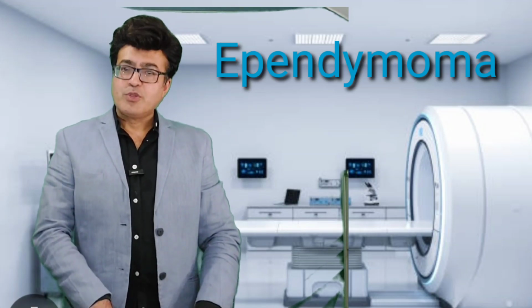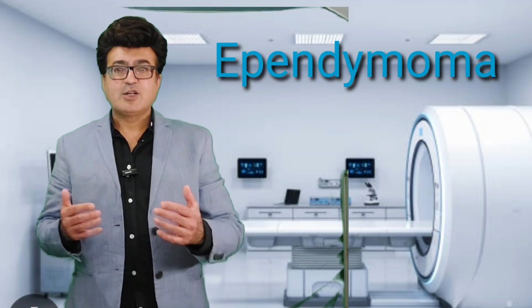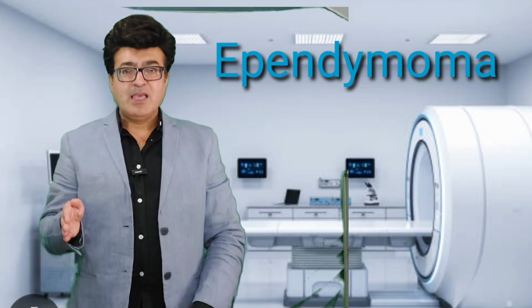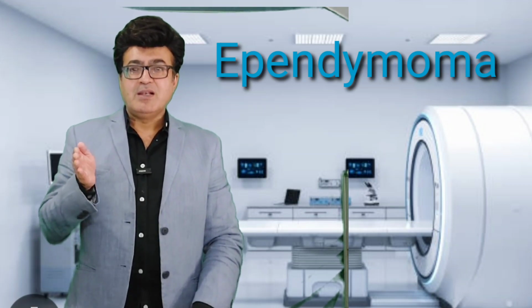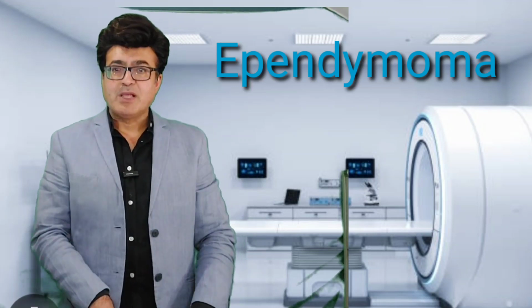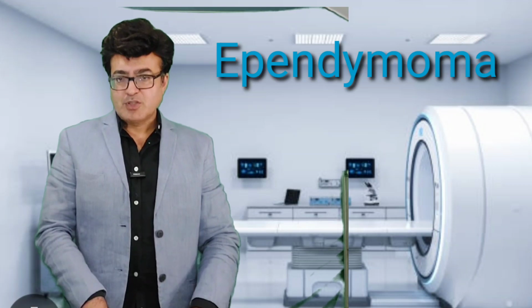One other point worth noting here is that it has a close differential with the medulloblastoma. Less frequently you will be able to see calcification in the medulloblastoma, while in ependymoma the calcification is frequent.